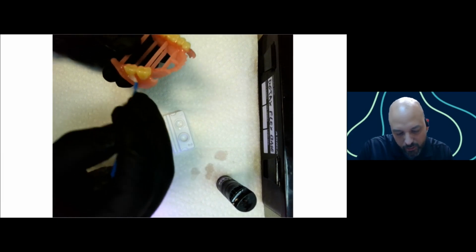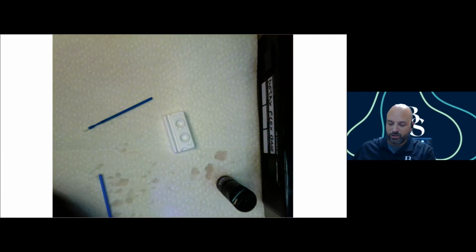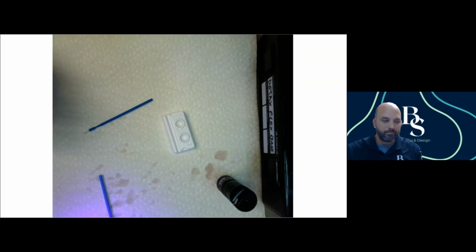That way I know that they're nice and sealed. If I get a little excess on the base, that's fine. When I go and do my finishing steps here, I like to pumice and polish these. I'll be able to blend that area. This will also save me from having to blend and do the teeth. All right. So now I'm going to take this to my cure box and we'll do the final cure on it.